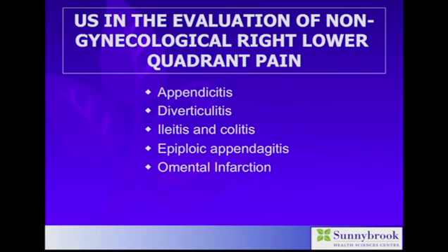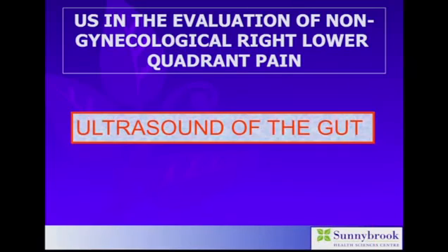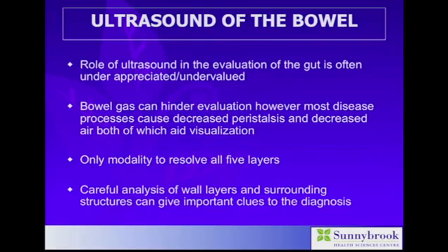In this talk, we'll be discussing the ultrasound appearances of appendicitis, diverticulitis, ileitis, and colitis. So essentially, this talk is about ultrasound of the gut. Traditionally, the role of ultrasound in the evaluation of bowel has been underappreciated and underutilized. People fear that bowel gas will hinder evaluation.